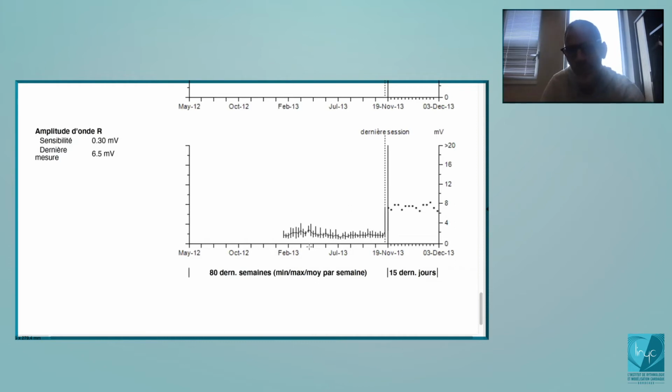In normal situation, I remain with bipolar sensing, because when you discuss with Medtronic engineers, they explain that all their ICDs have been tested and all the algorithms have been built with bipolar sensing. So they are not too confident if you program this pseudo-bipolar. But in this specific situation here, if you do not do that, then you will need to change the lead and replace the lead somewhere else, because you cannot work correctly with this kind of sensing with 1 millivolt. So in this situation, we could avoid the need to change the lead.